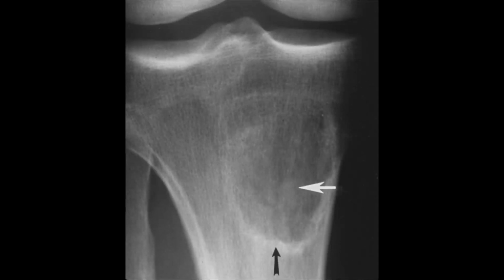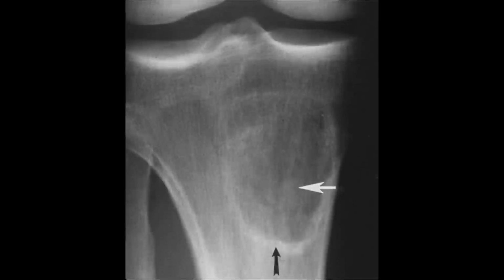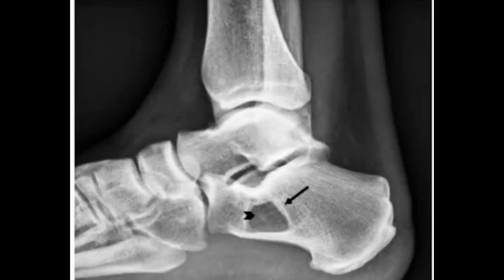Another example of the intraosseous lipoma, a typical lytic lesion. It's involving the metaphyseal area, the metaphysis of the long bone, with a sclerotic rim. You can appreciate the sclerotic margins around. This is a typical lipoma. So whenever there is a differential of a lytic lesion surrounded by sclerosis, always include the lipoma. A very important place for the intraosseous lipoma is the calcaneum.